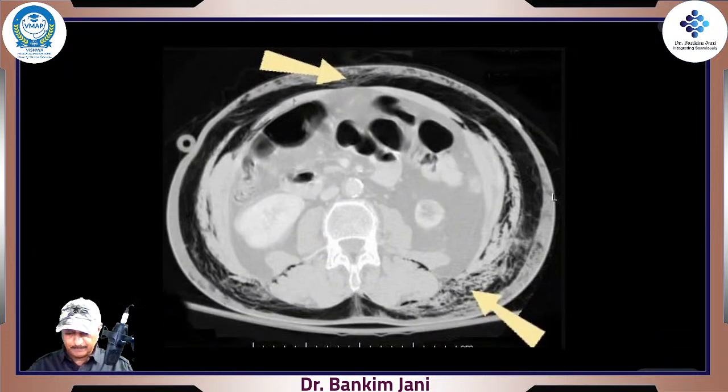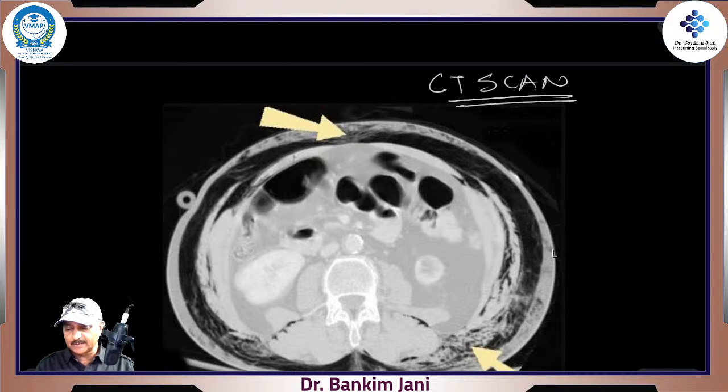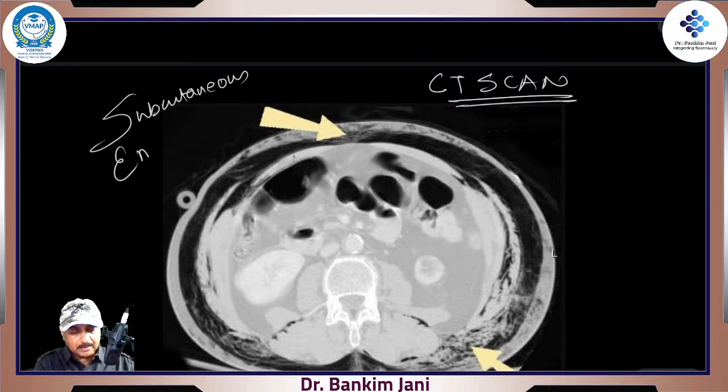And see over here, this one is the CT scan. Today there are lots and lots of images. See this portion where the arrow is put. This is subcutaneous emphysema, right? This is subcutaneous emphysema.